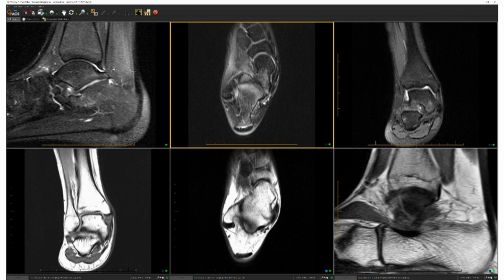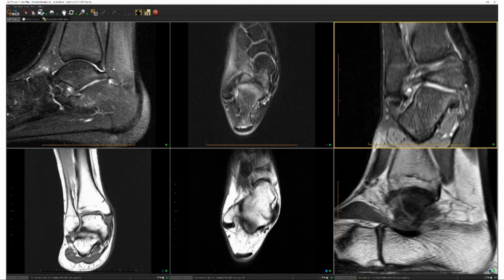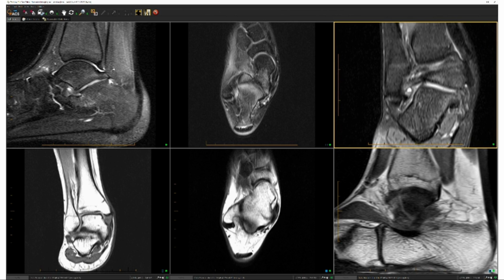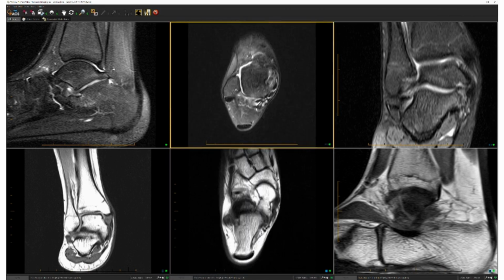And then the calcaneofibular ligament seen deep to the peroneal tendons here. That's actually where it's pointing to. And what I'm seeing on the peroneal tendons, the hammock-like band, this is the calcaneofibular ligament here, this structure here that sort of loops around and forms a hammock underneath the peroneal tendons. So that's slightly thickened there. We can see that on T1 weighted images there. So we have this mild sprain of the ATFL and calcaneofibular ligament. It appears chronic, and perhaps a subacute sprain of the PTFL.